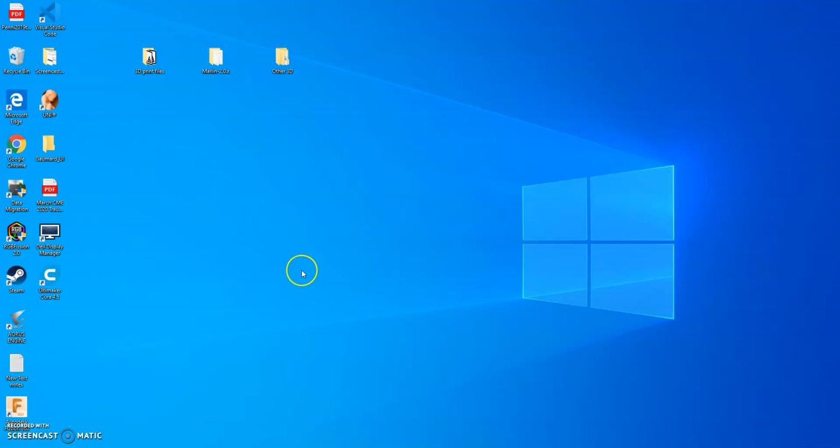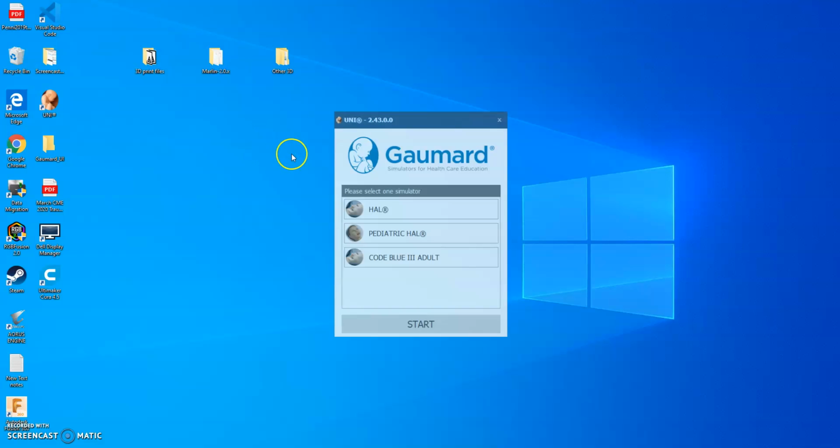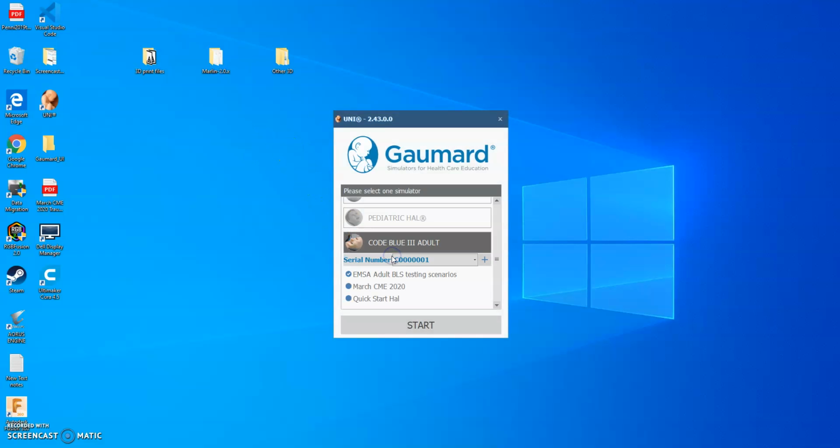I thought it might be helpful if I share with you the new BLS testing scenarios and how I built them for the upcoming Friday testing. So here you can see my cursor over here. Here's the uni program. I'm going to open this up. And the profile, go to Code Blue Adult, is EMS Academy Adult BLS testing scenarios.